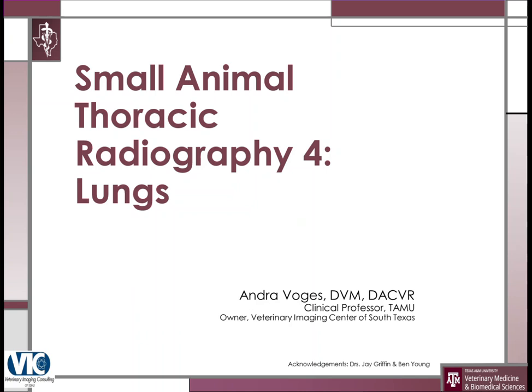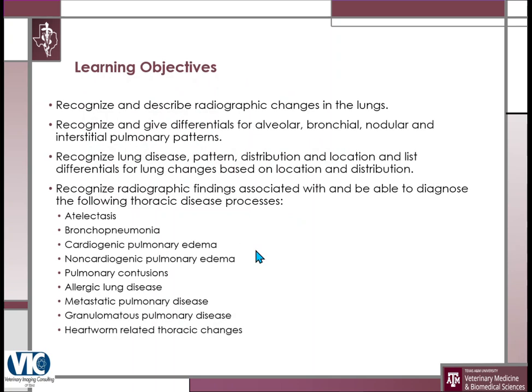We're going to continue our talk today and talk about radiography of the lungs. This is a pretty difficult topic that a lot of students and veterinarians struggle with, lung patterns. Well, I'll try to break it down and make it as simple as I can.